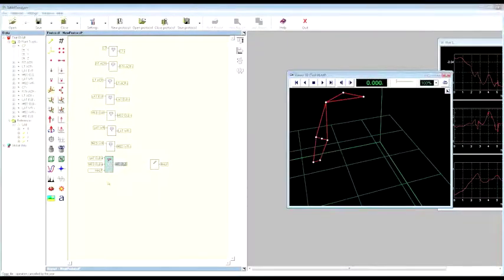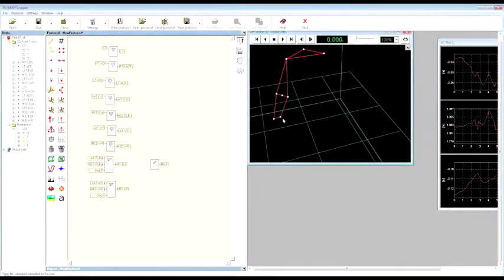So now we can do the same to compute the midpoint at the wrist. Okay, and also in this case I need to use the lateral wrist as the first input and the medial wrist as the second, and I can use the same half scalar value to compute the point that is in the middle of the two. And this is the result. So now I can start computing the angle.